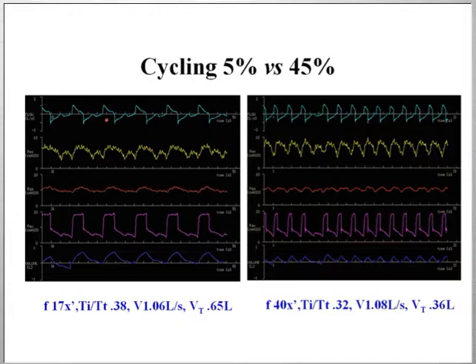And here to the left, you see how there is a major patient-ventilator asynchrony. If you look at the airway pressure tracings, you'll see that the respiratory rate in the machine is about 17 breaths per minute. However, the intrinsic respiratory rate of the patient, you see here plenty of wasted inspiratory efforts, which are missed, probably because the tidal volume here is quite high.